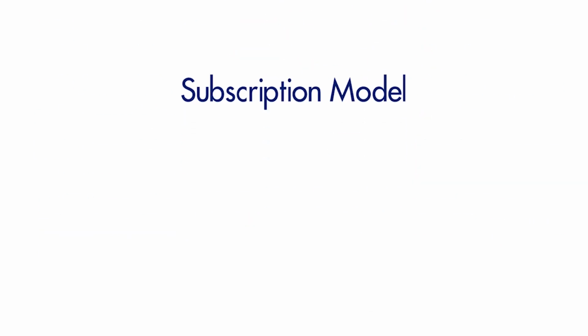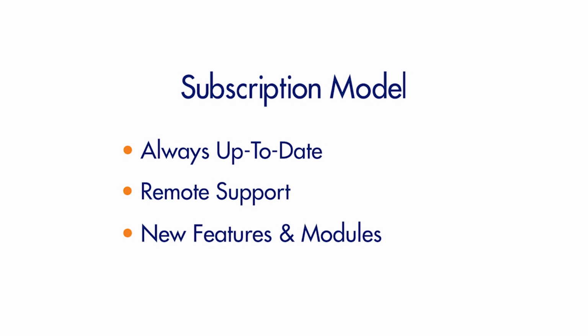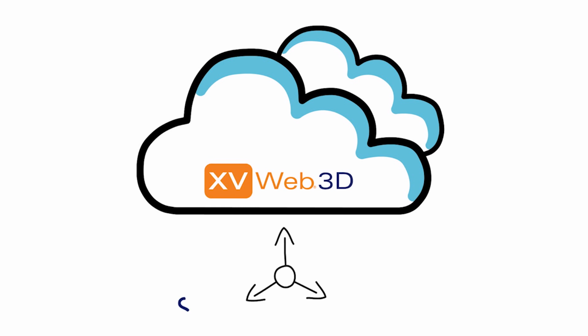XVWeb's subscription model ensures you always have the most up-to-date software versions as well as remote support, with a growing number of additional modules and technologies being released regularly. The new XVWeb 3D module allows for STL and 3D CBCT datasets to be stored, retrieved, and manipulated via the web.